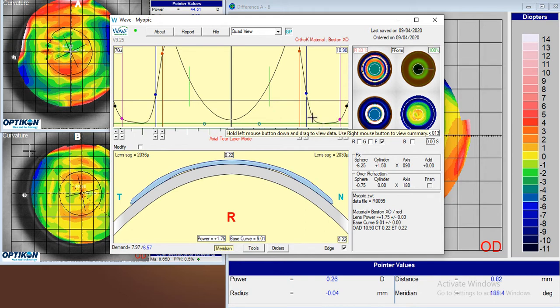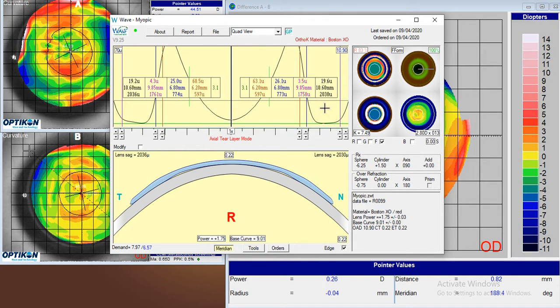we want more applanation here than we do here, then we're going to need a greater change at this control point. And we'll still push this one down toward the cornea a little bit more, but not quite as much here. I like to change it in increments of 7. So what I'll do is aim for a target of an increase of 14 here and an increase of 7 here. So our endpoints will be 787 and 1757.